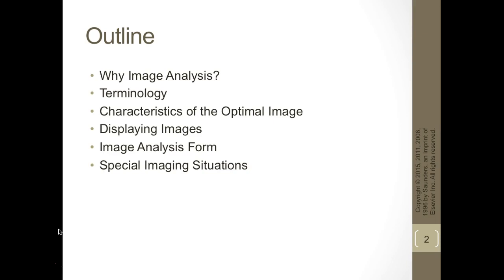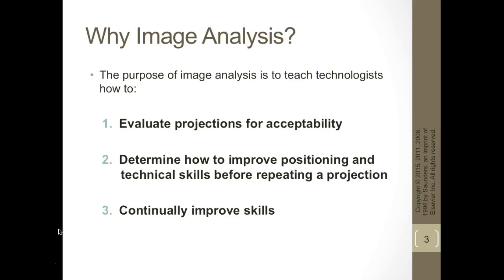We're going to look at here what is image analysis. So the reason why we do it, we need to look at the images and make sure that they are of quality so the radiologist is able to read the image and find a diagnosis for the patient. So, evaluate projections for acceptability, determine how to improve positioning and technical skills before repeating the projection.